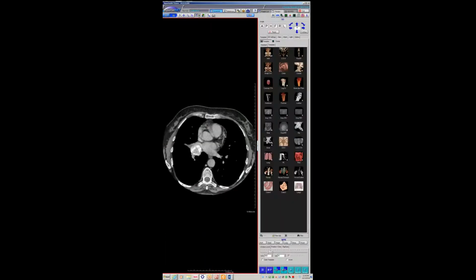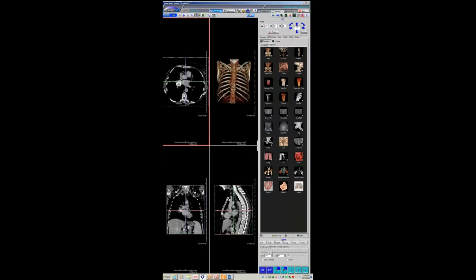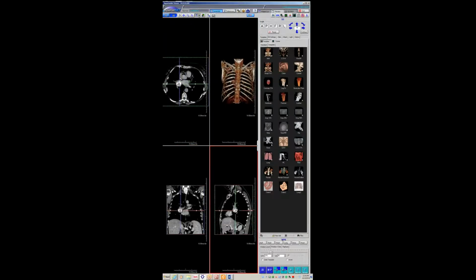Was there atelectasis there on the lateral view as well? Yeah, absolutely. This was a carcinoid, an endobronchial carcinoid. It's just one of the bigger carcinoids I've seen. And we know carcinoids don't have to be endobronchial. Most of them were thought to be endobronchial, but I think that's kind of shifted.